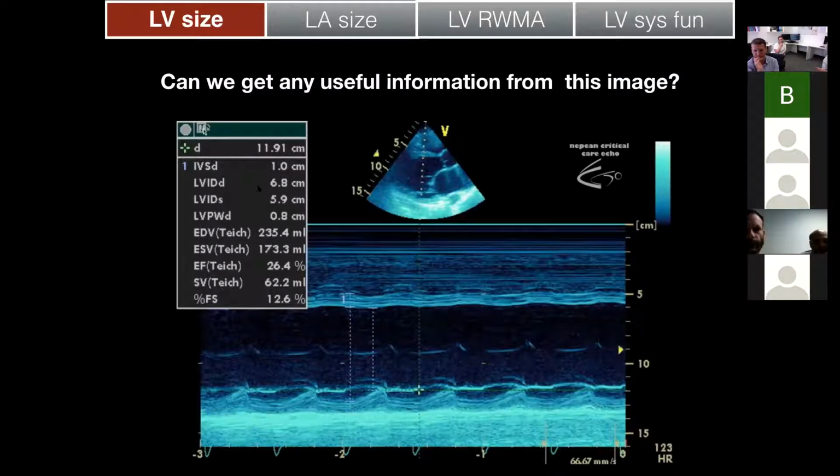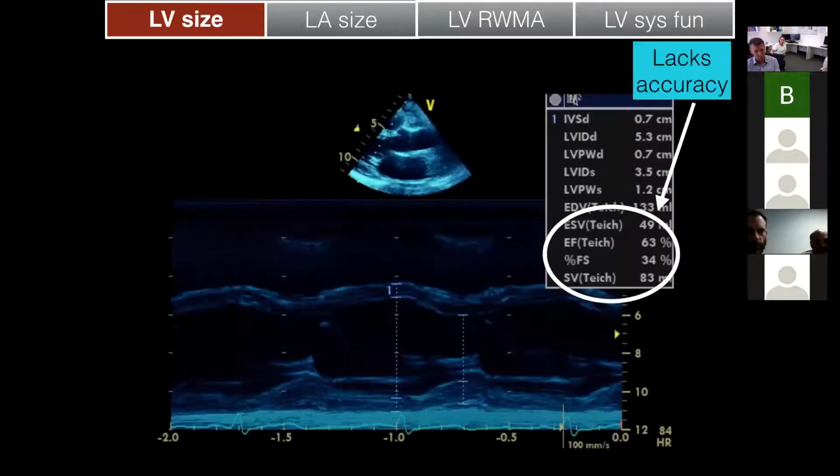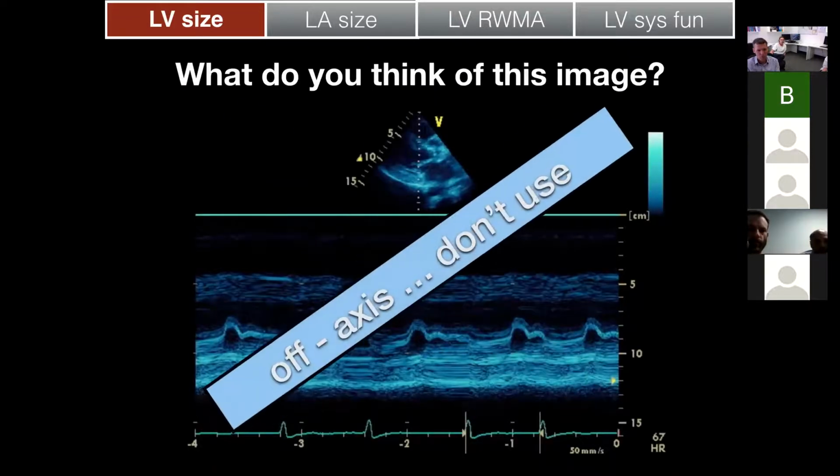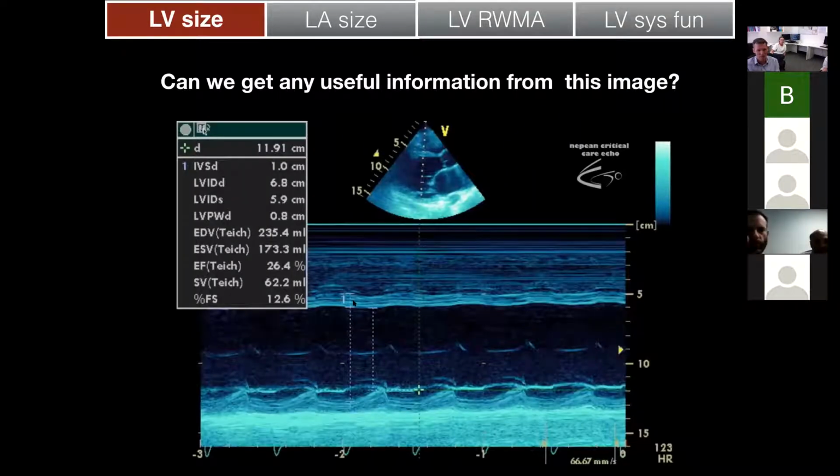I'm not sure about the systolic function, whether we can assess it with this image, but definitely the chronicity depending on the wall thickness, and obviously the contraction, we can assess the regional wall motion abnormalities, I think. So I think there are a couple of clues that we can pick up about systolic function on this. So I agree with most of what you said. But if I show you normal, so that's normal, right? Can you see how the walls go together during systole, approximately the same amount each time?